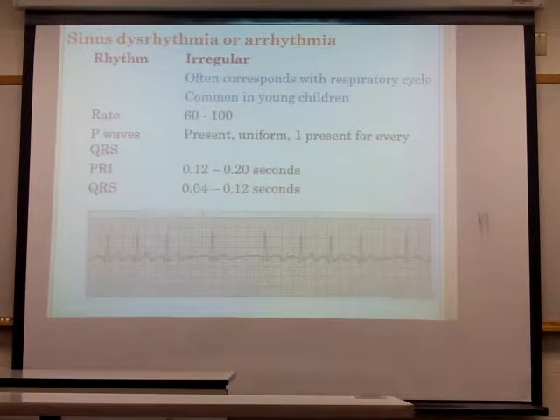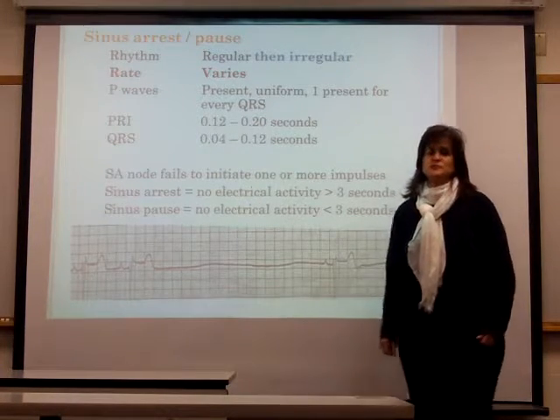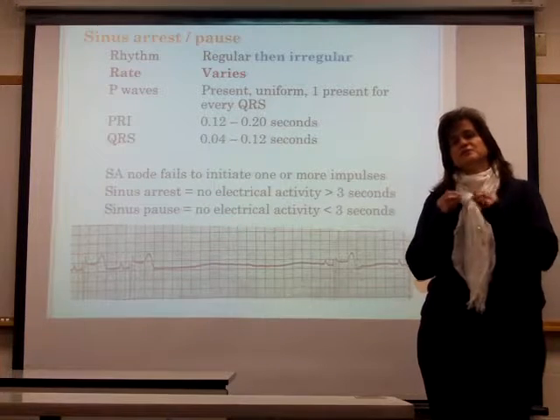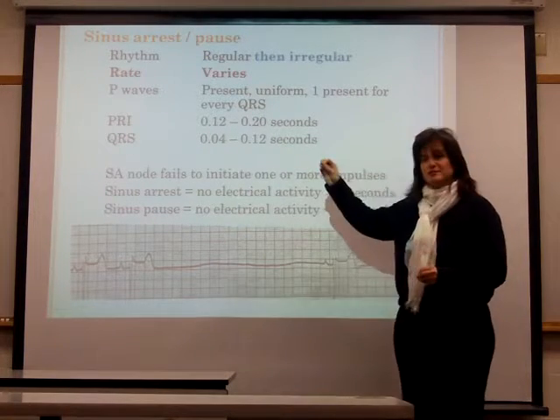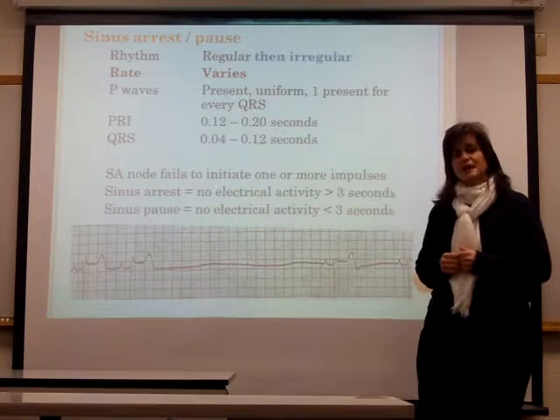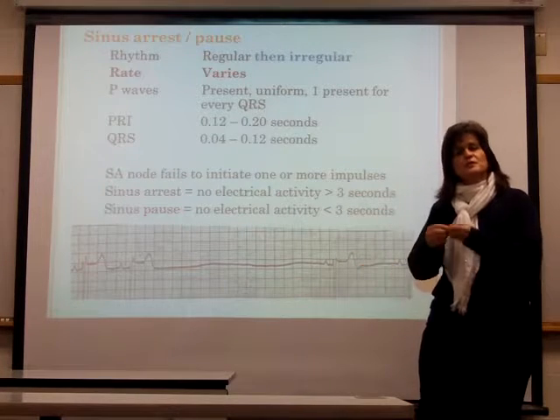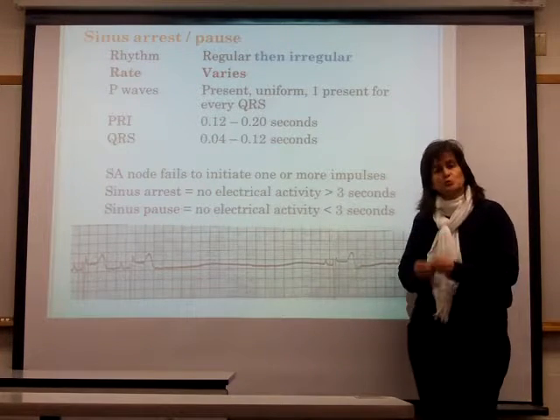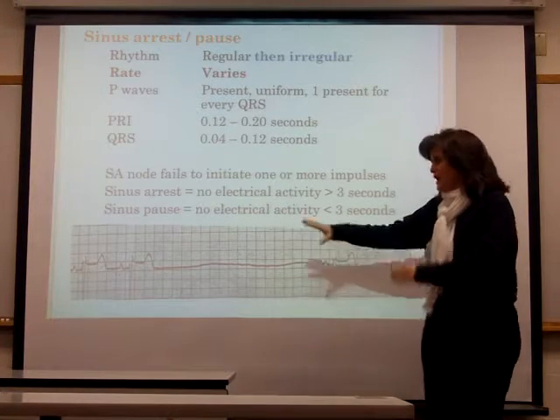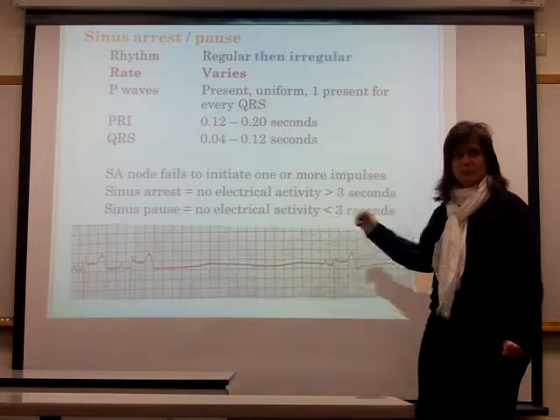The last thing we're going to talk about is what we call a sinus arrest and a pause, or a sinus pause. It's important for you to know that to say someone has sinus arrest, you're basically saying they have asystole. If you say someone has sinus pause, then you're giving me very little information. If you truly have sinus arrest or sinus pause, you have to have an underlying rhythm to denote those two things, arrest or pause.